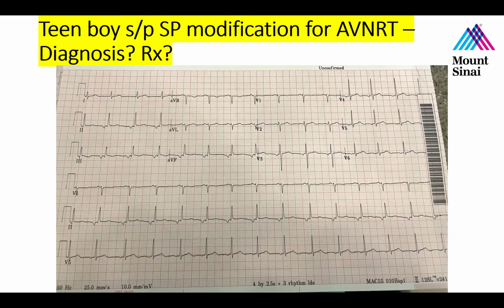Looking at our rhythm strip, it appears that every P wave is conducted, but I do have concern about this PR interval. What is your concern about it, Dr. Capon? It looks narrow. It's short, you mean? Short. Yeah, sorry, it looks short. Intervals are not narrow, they're short or long. So you're saying you think the PR is a little on the short side. Exactly. Yeah. Is there pre-excitation though?